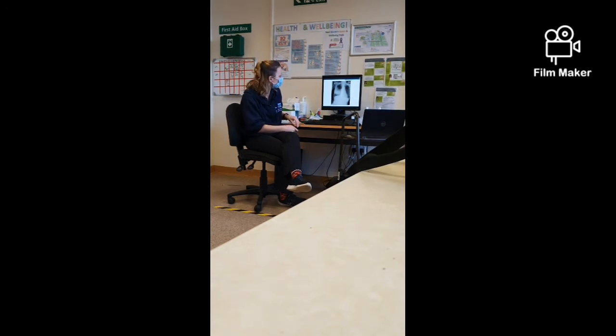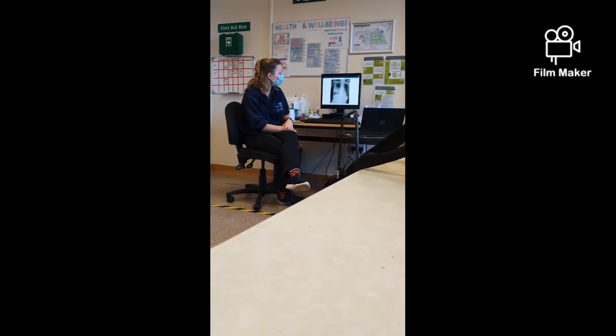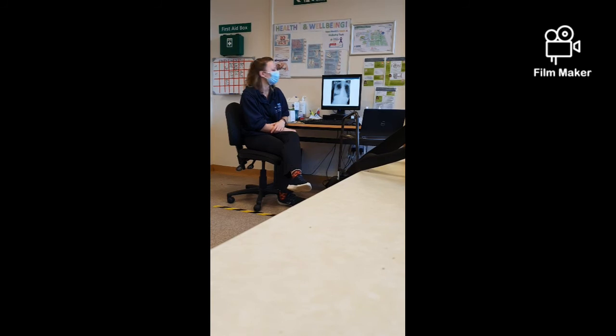What do we think? We'll look at the ribs. It looks relatively equal. It's a bit more difficult because it looks like the body's at a bit of an angle. Yeah, it definitely is. You can see there it's semi-erect and it's immobile, so this patient will have been quite poorly when this was done. Yeah, so they look quite equal, don't they?